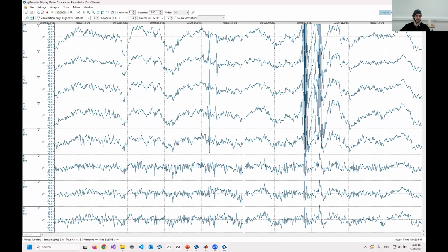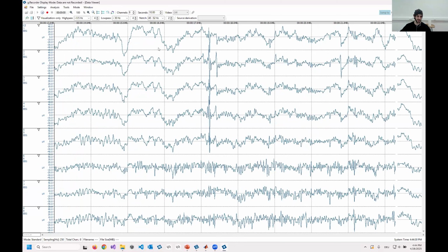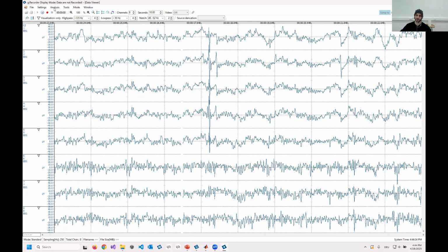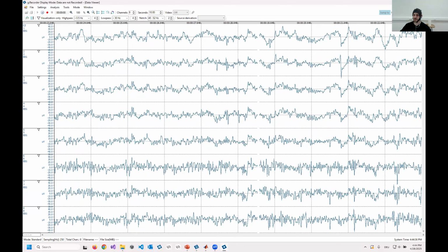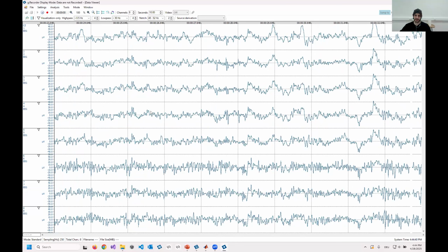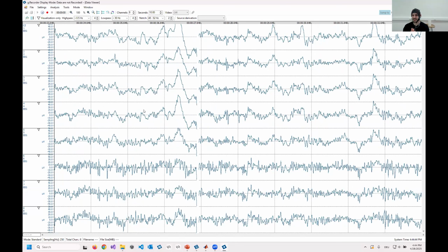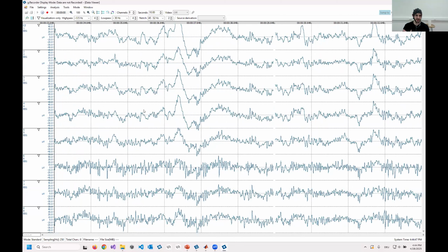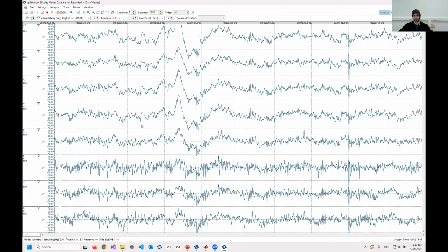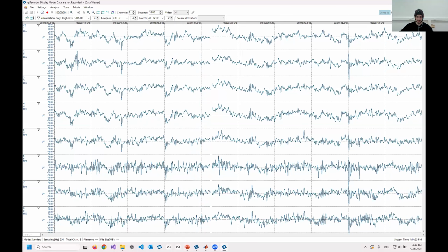So that looks good. In g.Recorder, you can additionally record to HDF5, which is also a commonly used file format. You can do event-related potentials within g.Recorder. Basically, you can replay files. So basically, everything from visualizing EEG, preprocessing EEG, recording, and processing EPs can be done in Recorder.